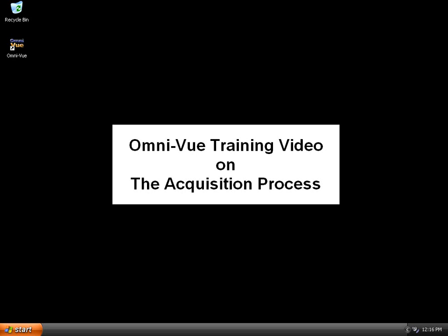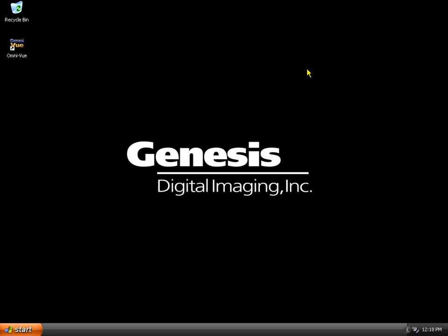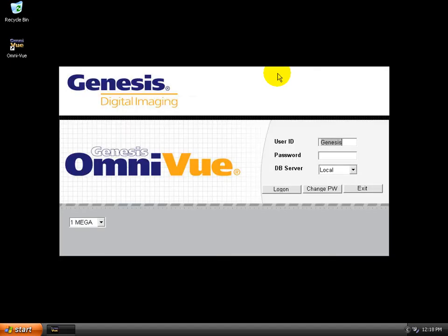Welcome to the Omnivue training video on the acquisition process. We begin by double-clicking on the Omnivue icon on your desktop. We sign in with the username Genesis, password Genesis, and click Log On.